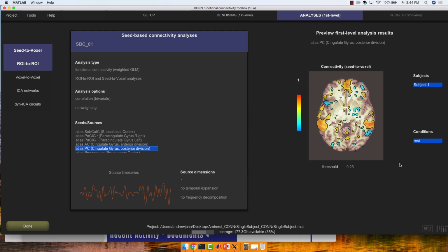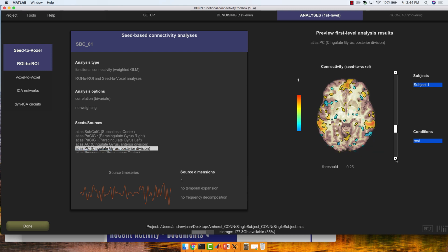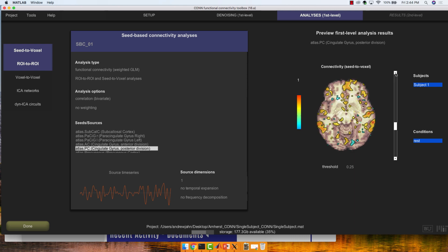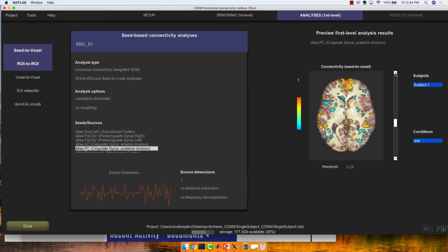Can you enlarge that window? I can't, sorry. No, I mean, can one. Oh, on your machine? Yeah, this is teeny. 164. There's a networks.default mode.pcc. There you go. Say that again? Networks.default mode.pcc.